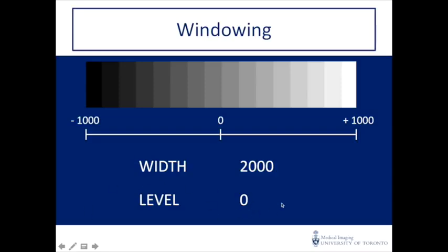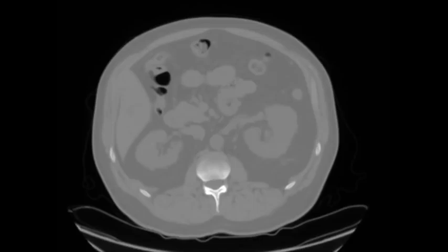So let's pull up an axial CT slice using this particular window, which we said is not that good at looking at the soft tissues. So here is a single slice of the abdomen with that particular window. This is a kidney, this is a kidney, and over here on the right side of the image is where I want you to focus. This is the bottom of the liver. Okay, with this particular window, the liver looks pretty homogeneous. You would just scroll right by it, of course.